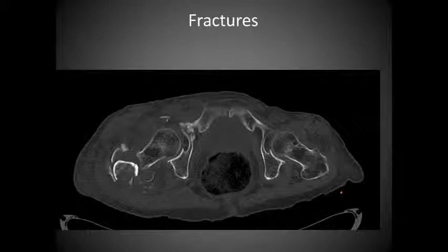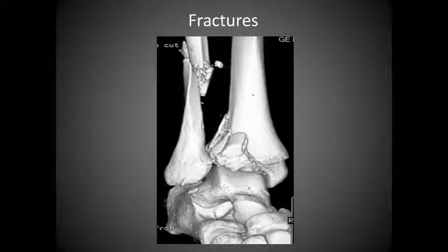So here we can see that this patient has several fractures. Here, and the most obvious here. But also notice that there's something going on in the pelvis here, here, and so it can be argued whether this patient has osteoporosis or this patient does have bone mets.